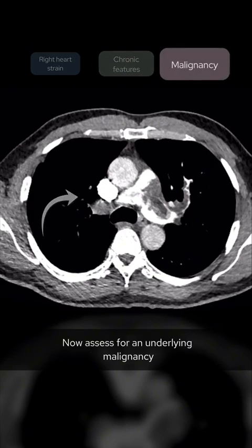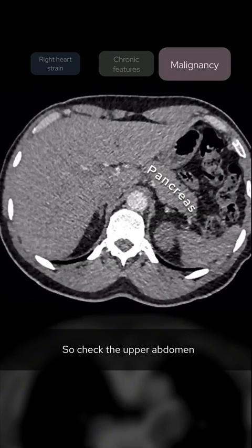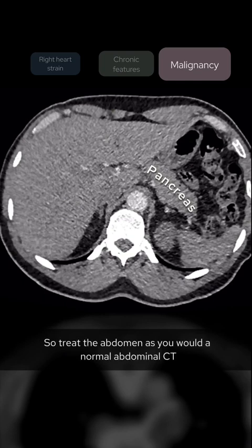Now assess for an underlying malignancy. So check the upper abdomen. There are subtle pancreatic malignancies I have seen on the bottom slices of a CTPA scan, so treat the abdomen as you would a normal abdominal CT.